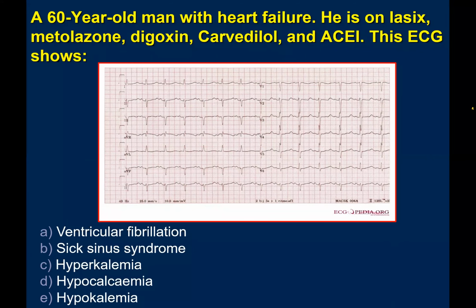Or what could the ECG show, sorry? Maybe sometimes they don't have symptoms. A little bit, this one is difficult, so I'll give it to you just because... Can I try? Yeah, please go ahead. I can notice that the QT interval is prolonged more than usual. And the question makes me think of only digoxin toxicity.